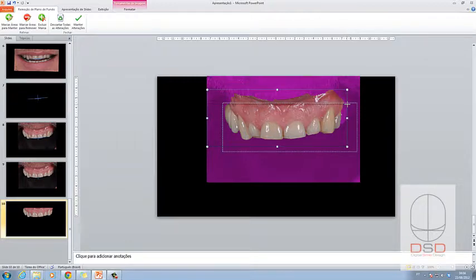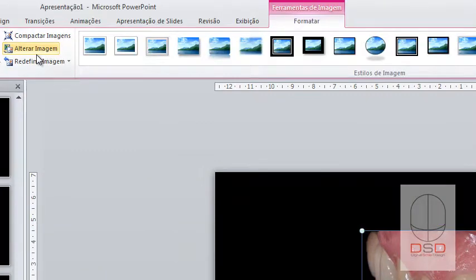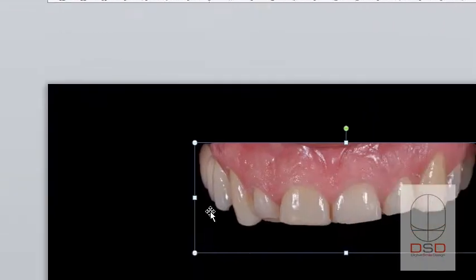I don't want to cut that area on the back. Okay, now it is much better. And if I want to keep this little tip here, I can do that, and then I can add this to my rectangle. I'm gonna also keep this area here. Perfect. And now I can just say check. I'm gonna keep the changes. So now all the background is removed, and I have a very nice image back on my screen.